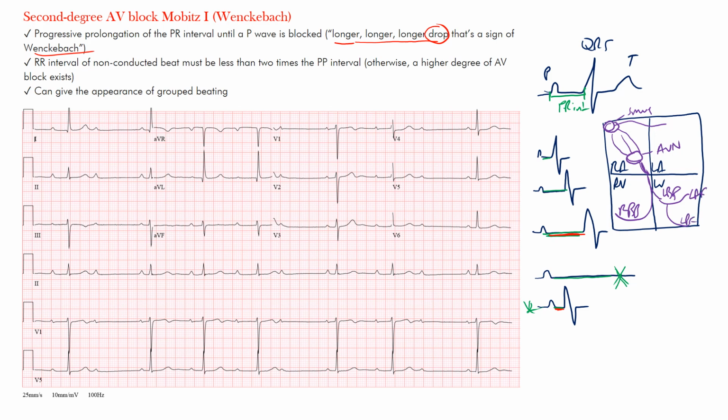Okay, and what we're saying is that you have slow conduction, or you may have an initial normal conduction. Okay, so conduction flows normally, but then maybe afterwards, the next one, you have maybe a small block. Okay, and that's what lengthens the PR interval. And then the next beat that comes, maybe there's even a bigger block, so maybe even a thicker line. Okay, and that's prolonging the interval. And the next beat may have an even longer block that almost makes it complete, and that's why no beat can get through, and that's why it's dropped, okay?